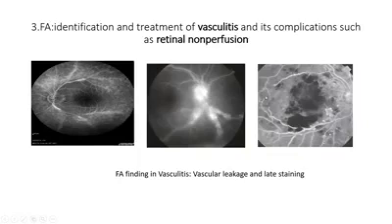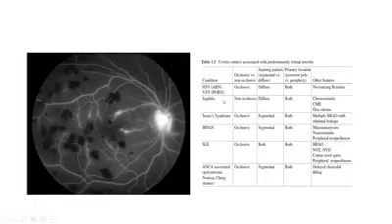And this is quite important to limit the differential diagnosis of posterior uveitis, such as in this case, in which the occlusive vasculitis involves predominantly the retinal arteries. We can limit the differential diagnosis to a short list of diseases like SLE or polyarteritis nodosa, or infectious causes like herpes or varicella zoster.